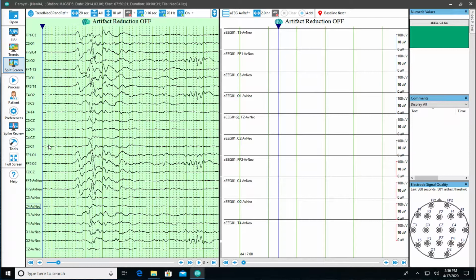And here's why. It's entirely possible that a place doing two-channel AEEG, sort of cerebral function monitor style of AEEG only, may, for different patients, different neonates, apply a full double distance neonatal application.